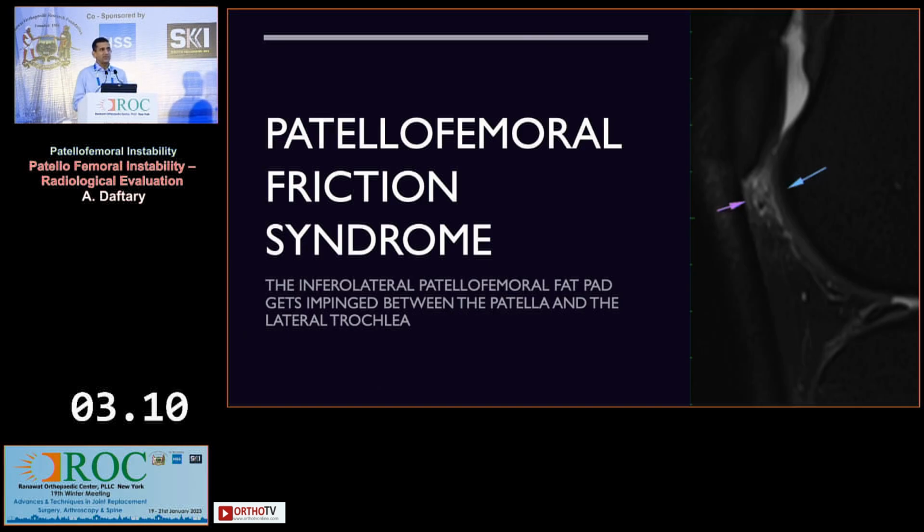A quick word on patellofemoral friction syndrome. This is something we see fairly often in the young population. Chondromalacia patella is the other situation that we always talk about with patellar cartilage changes. But patellofemoral friction syndrome is something we raise the possibility of when we see some soft tissue edema, especially in the lateral infrapatellar fat pad. Again, this is not a 100% thing. Just seeing edema does not mean that somebody has patellofemoral friction syndrome. I will often end up mentioning it in situations where I find nothing else in the scan, or they give me very clear insight that somebody's got a patellofemoral problem.